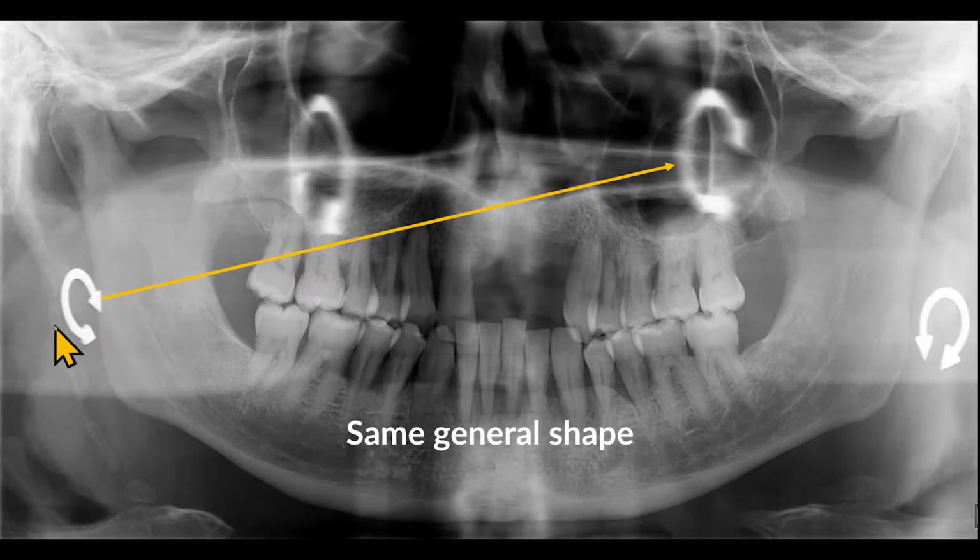If the object is a square, the ghost may be a square or maybe a rectangle. So a circular object will not become a square or a rectangle, or a square will not become a circular structure. So in this case, the overall shape of the earring, the general shape, is maintained in the ghost image.